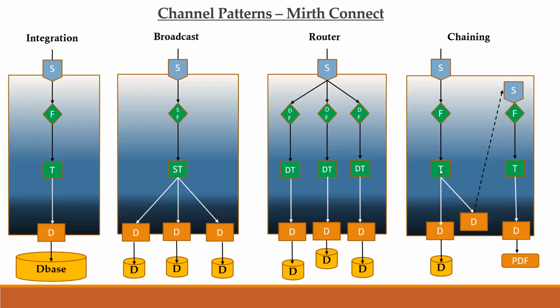Okay, as you are interconnecting channels inside a channel, this is called the chaining model. This way you can connect as many channels as you want, so that you can internally manage the channels and create a chain if required. This is called the chaining pattern.